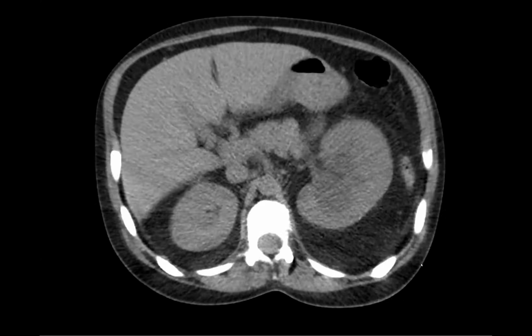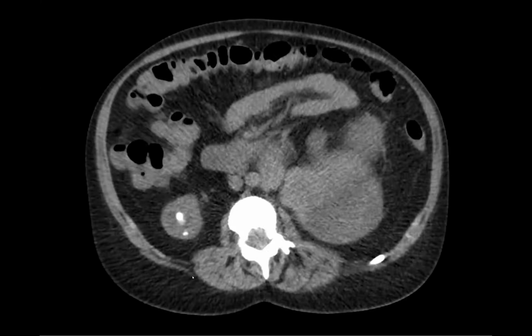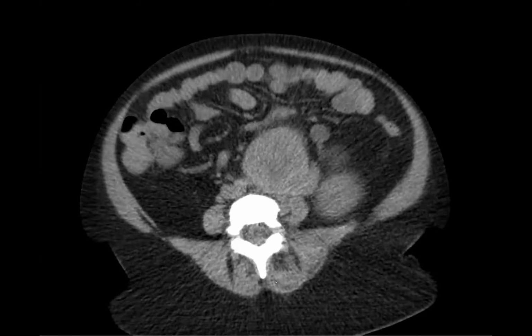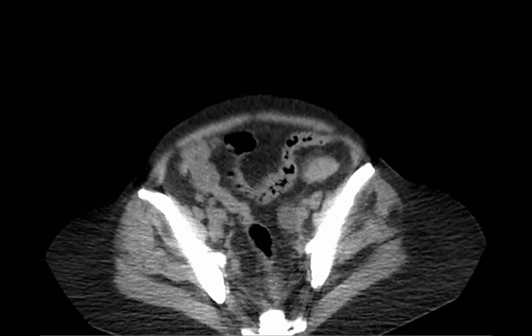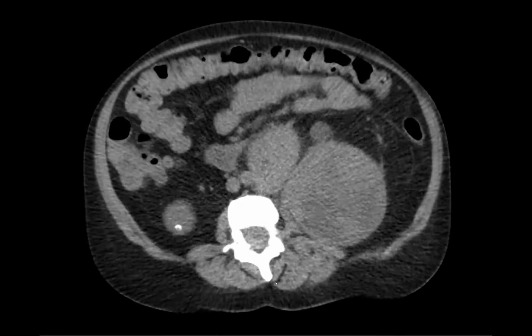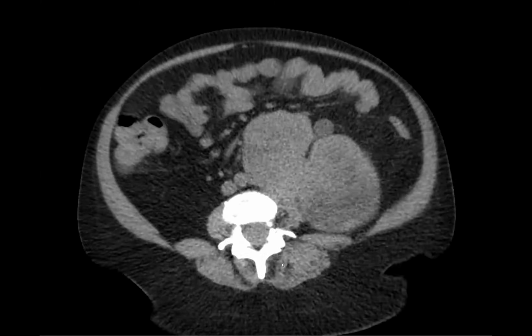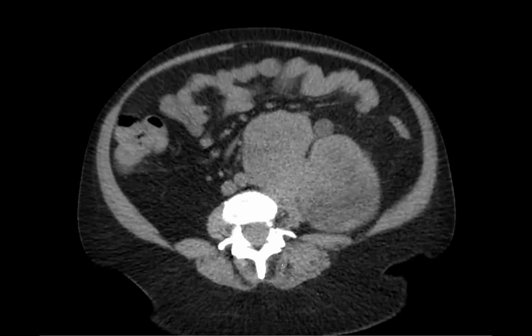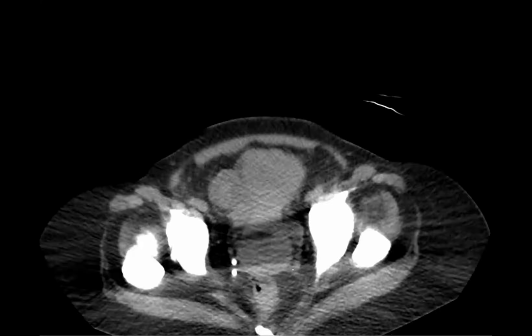Okay, this is a patient who has some hydronephrosis, renal stones, and this retroperitoneal mass. Any thoughts about the mass? Is it a male patient, Aarti? It is, yes. Okay. No, sorry. This is a female. Okay. There is a clue down here.